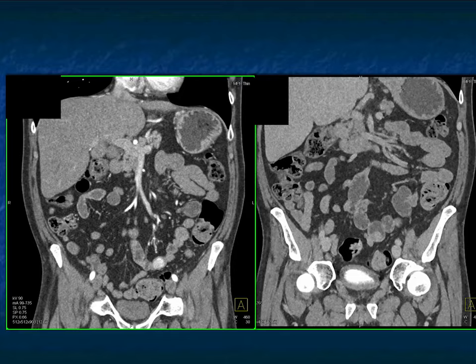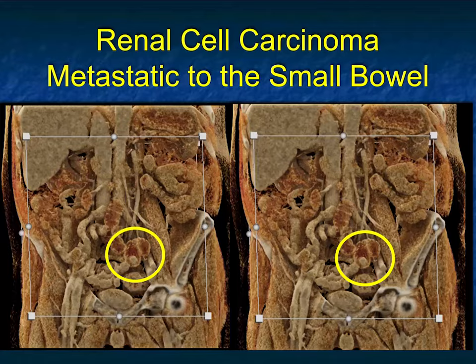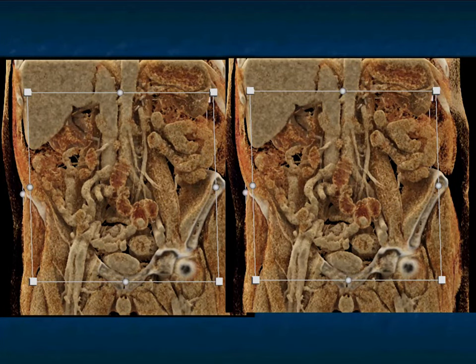But again, the importance of arterial versus venous phase imaging, and how it's important to be able to pick up even these subtle lesions, which again is shown very nicely in this case on the cinematic rendering. As we've spoken before, we do a lot of cinematic rendering, and I am trying to automate the cinematic rendering with AI, or using some AI, to help us pick up these smaller lesions. Again, the ability to change the parameters and look carefully become very, very important, but can be very challenging when you're very busy in clinical practice.